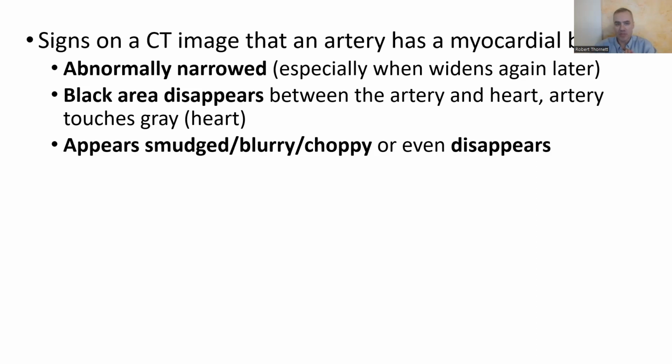If you think your doctor may have missed it, or if one said you had a myocardial bridge and one didn't, well, now you can check yourself and see, do I have one or not? Usually the experience on our site is that if somebody said you had a myocardial bridge, 9 times out of 10, you do. Once in a blue moon, I can count 1, maybe 2 people who turned out not to have one. But almost everyone whose scan a radiologist at some hospital found a myocardial bridge on, even if some other one later said they didn't, it turned out that they did. It's usually the case. I won't say always, but usually.